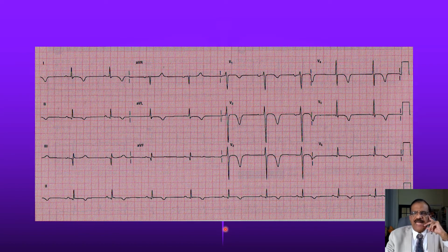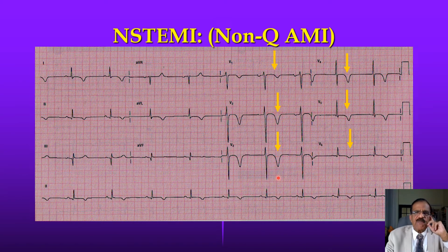I don't see any ST elevation. How about T wave inversion? Yes, we have T wave inversion. No ST segment elevation here, here, here, or here. There is T wave inversion in multiple leads, and this is perhaps NSTEMI if trop T is elevated.